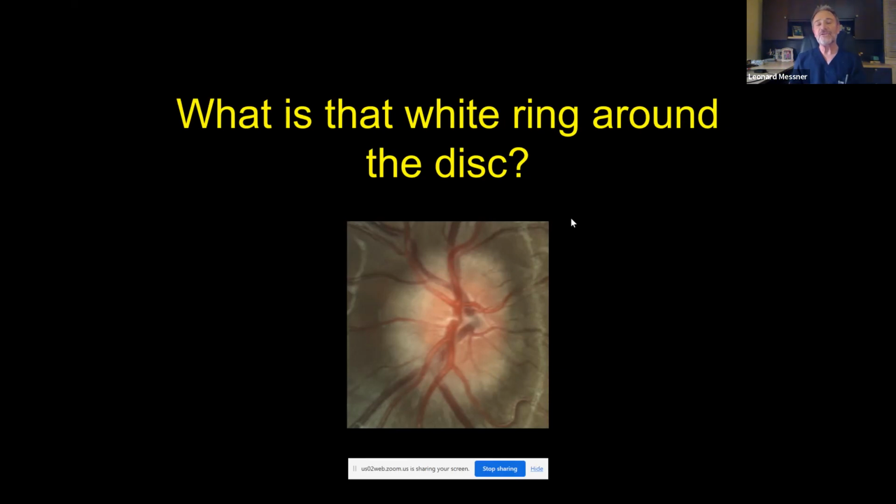So you cannot simply look at the optic nerve and assume that, well, it's an anomalous nerve, small cup, fits all the characteristics, even in the presence of optic disc drusen, and say, well, then that must mean it's pseudopapilledema. Certainly they may very well have pseudopapilledema, but they can have true papilledema right along with it. I think the kicker is, if it's pseudopapilledema, you're probably not going to get the peripapillary wrinkles, and you're not going to get the inward deflection of the RPE Bruch's membrane complex. You'll get both of those if it's true papilledema.